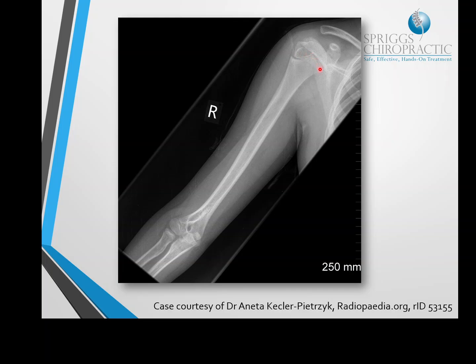And up here we've got the growth centre, the epiphysis of the humeral head with its growth plate still visible. You've also got the superimposition of both sides of the humeral head, which would form what is often described as a pseudocyst. This looks very, very similar to the appearance of a simple bone cyst just there, so all of my students who have recently gone through benign tumours will know to be a bit more concerned about that. We've got the distal clavicle and of course the rest of the scapula, and on this particular image we can also see some ribs.